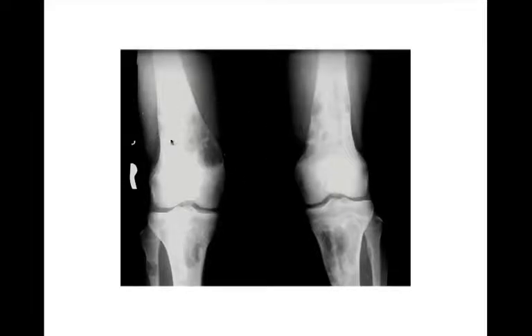So if we just thought about one of these, well, what would one of these be if we describe it as such? Well, we certainly described it as a non-ossifying fibroma, right? Cortically based or eccentrically located, geographic, narrow zone of transition, sclerotic rim. It's located in the right place in the metaphysis. And so we could say, well, a non-ossifying fibroma would be a good thought for that. This patient had multiple non-ossifying fibromas in Jaffe-Campanacci syndrome, which if you remember is associated with cafe au lait spots.